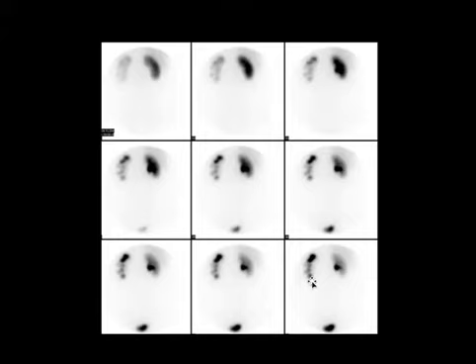As I was telling you before, the appearance of obstruction on a renal scan depends on the chronicity. So the earlier two cases we saw where there was UPJ obstruction, the flow and function was preserved, but there was stasis which did not respond to Lasix. But here, the obstruction is a little bit more chronic or long-standing, because of which, secondary to the back pressure of all the urine in the collecting system, the function and the blood flow are compromised too.